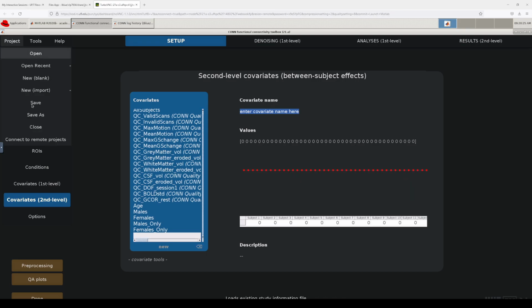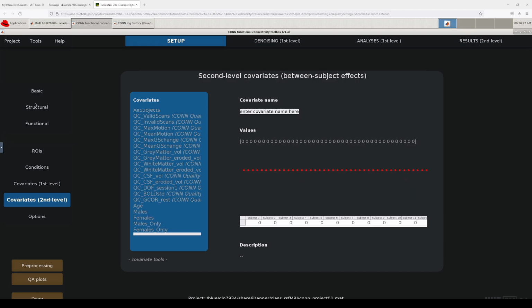So at this point, I like to save it. This will just save the project. If my computer crashed, HyperGator is still running, or the job ended, then I'd still have it. If somehow I didn't give enough time, I'm running out of time, HyperGator would end this process.